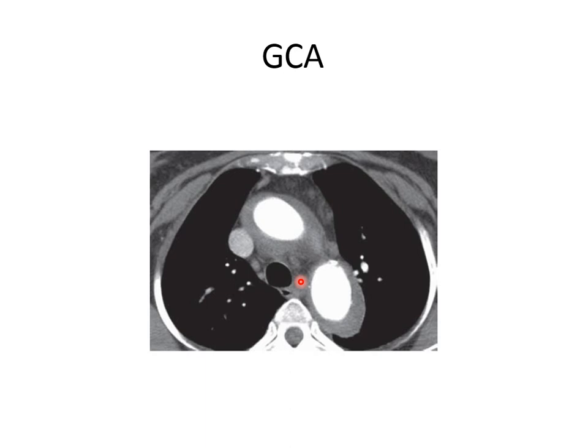You see that it is not as specific to say thickening of the wall. We see thickening of the wall in Takayasu, and here we can also see concentric thickening of the wall of the ascending and descending. But the important thing is the distribution, the age of the patient, the history, the association of the features. In Takayasu, we said abdominal. Here we say ascending aorta. If we take the history and know that the patient has a history of cranial symptoms referred to the cranial arteries, we can think of giant cell arteritis.